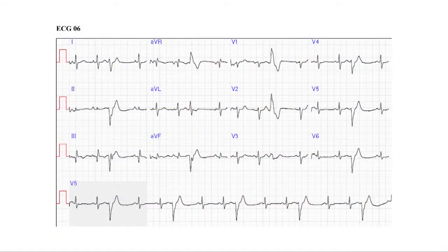It otherwise looks fine. Slide number 6 shows again a fairly common finding, and the patients do often complain of an occasional thump in their chest. Is this something we should be concerned about? Ventricular ectopics are incredibly common. Almost everybody has at least 1 or 2 ventricular ectopics. Some people feel them, some people don't.